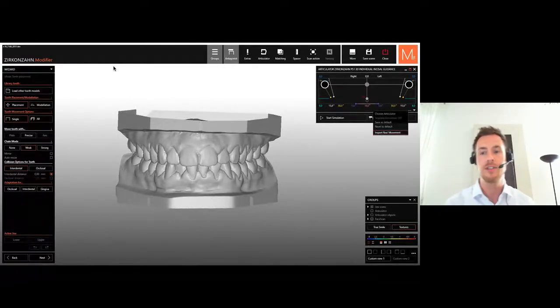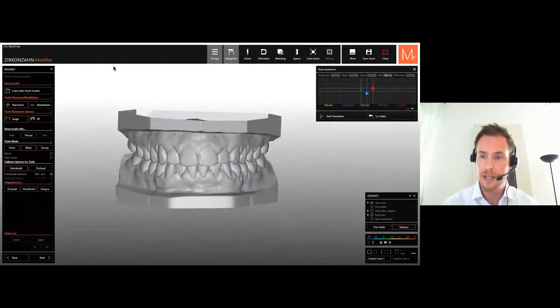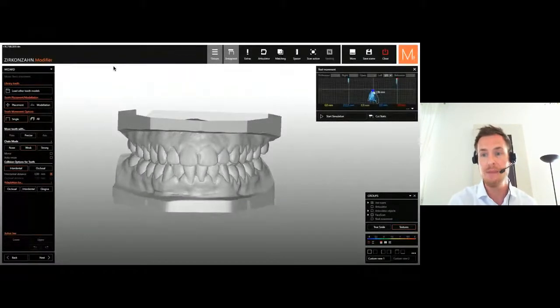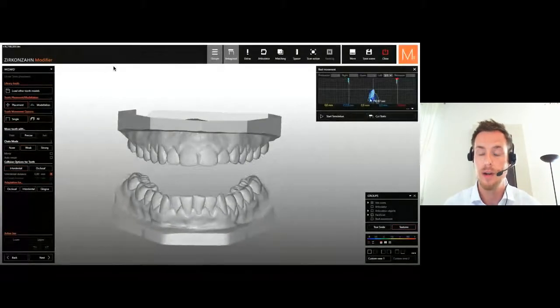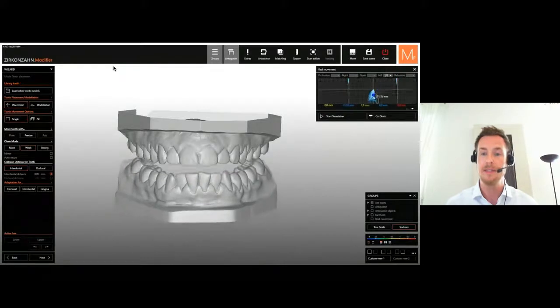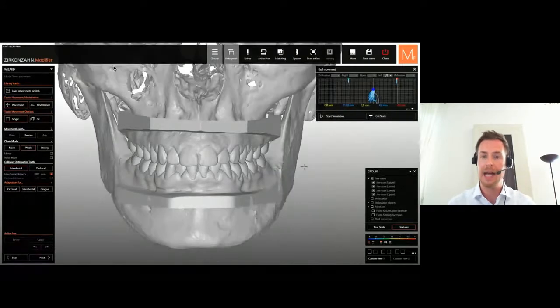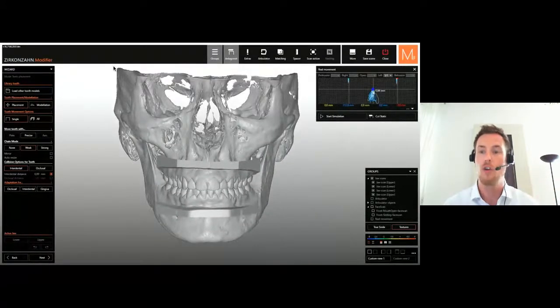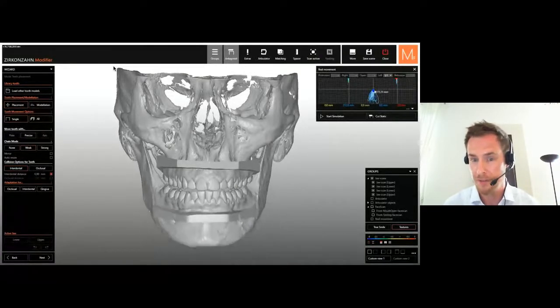There the import is free and quite easy. After that, the 3D articulator is not used anymore. We use just the movements we recorded before. And this is amazing because now I'm able to place teeth regarding the movement, and I'm able to create individual occlusion patterns regarding those chewing movements, for example.